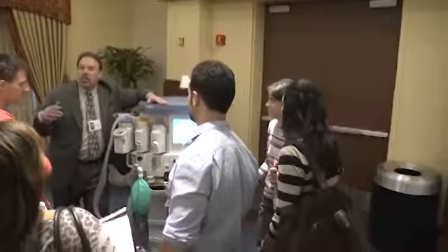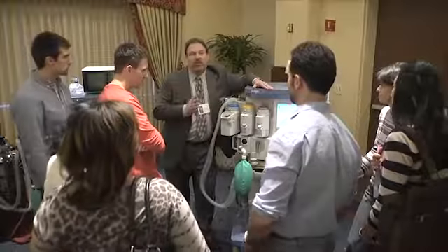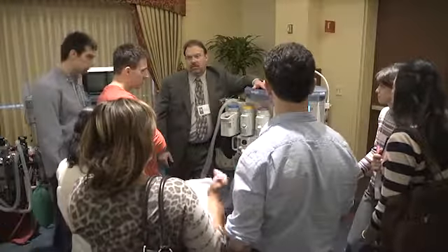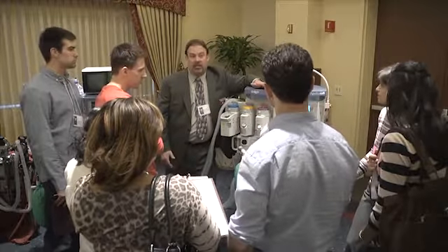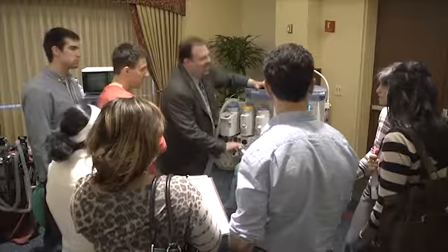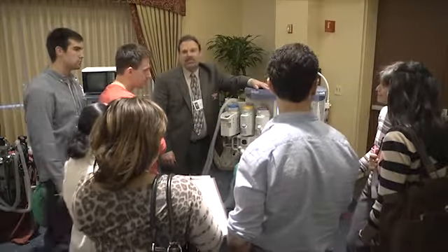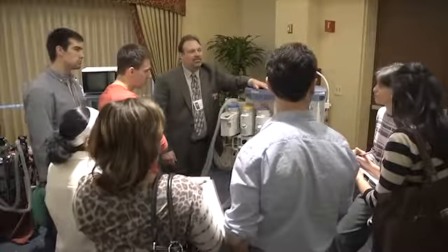Now, when you go out of vent mode and you're in spontaneous mode, then your timing on that goes from 15 seconds to 30. So every 30 seconds you have to cross that. But you can't just disable it. You can turn it down. These are all safety features. We press the alarms down because they're annoying, but the next thing, in the next 2 seconds, is to do something about it and check what's the problem.